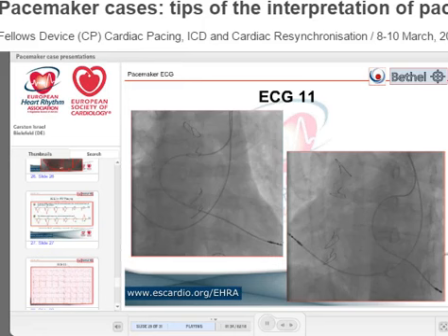In fact, it's funny, I'm an adult cardiologist, I don't know these funny things. I showed it to a pediatrician. He said, yes, of course, this is a typical unroofed coronary sinus. The CS has no roof. There's a short circuit to the left atrium, and this is going directly to the left atrium, across the mitral valve to the left ventricular apex.